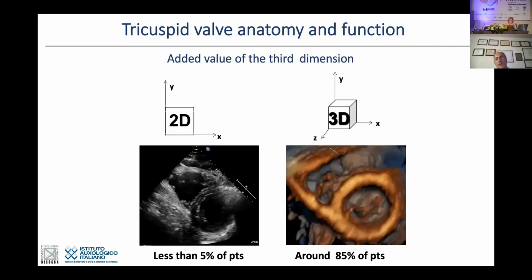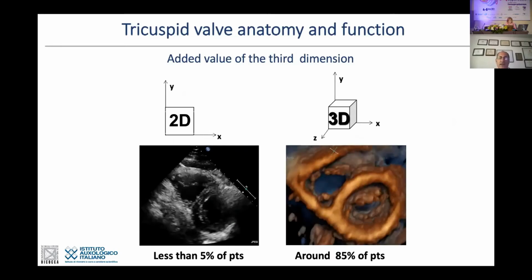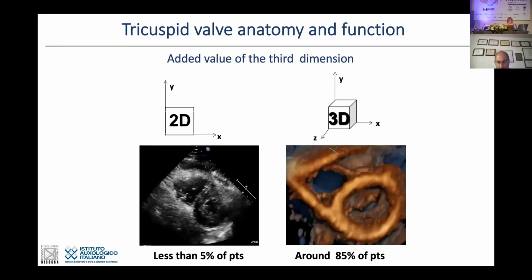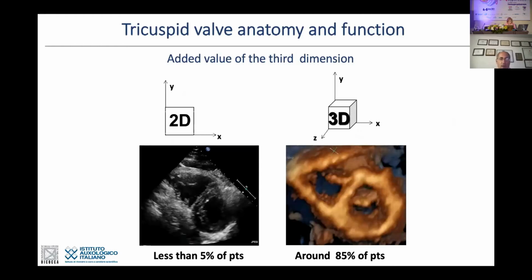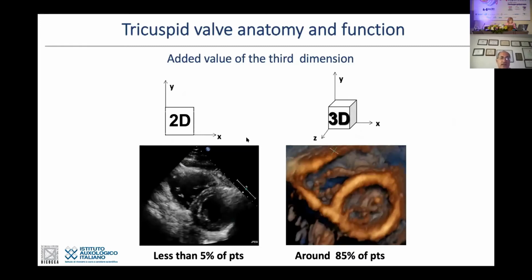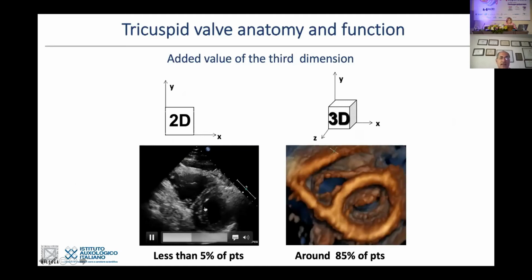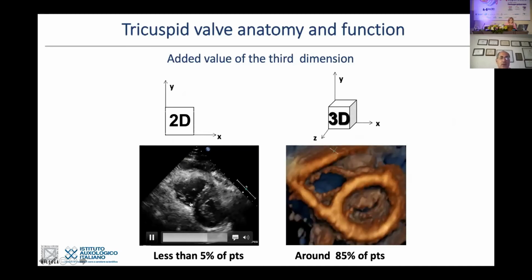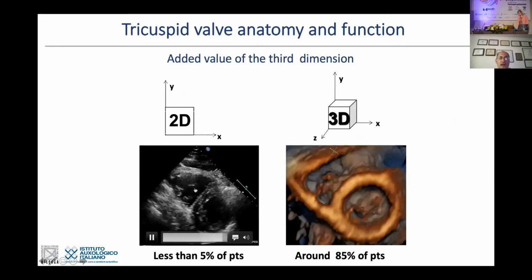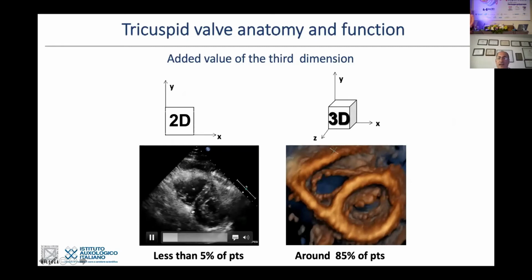And as we have seen already with the mitral valve, but much better here with the tricuspid valve, with 2D echocardiography, what we can achieve, but just in a minority of cases, is to see all 3 leaflets in one short axis view, but then what you see is just the margin of the leaflets that are dancing into the dark of the atrium.